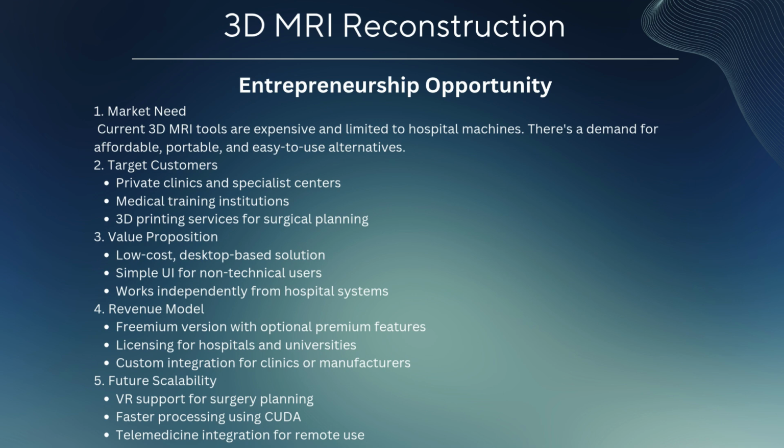The value proposition lies in its affordability and user-friendliness. It offers essential features like interactive model controls and STL export in a simple interface that doesn't require technical expertise. Plus, since it is a desktop application, it's not tied to any specific machine or location, making it more accessible.